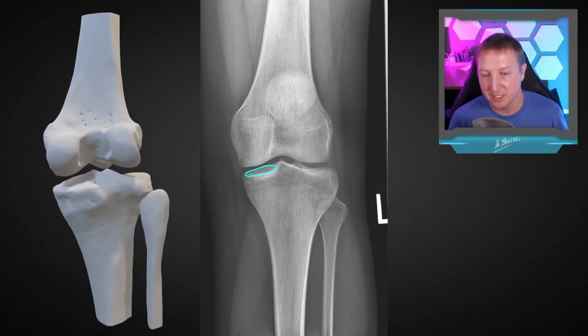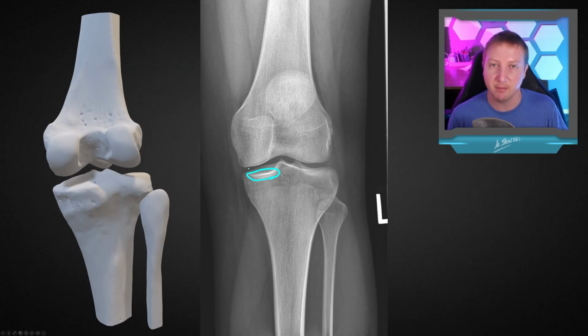And the mistake I see a lot of people make here is that when they're looking for joint space narrowing, they look between the back edge of the tibial plateau here, and they're saying, maybe there's joint space narrowing, but we should actually be looking more towards where the weight-bearing sclerotic line is here, okay? And so the medial compartment often will have a pretty dense amount of sclerosis just because that's the weight-bearing compartment where most of our weight is being distributed across, so you have to have a bit more calcium there structurally to support that.